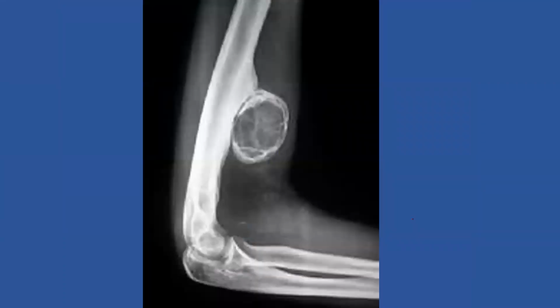So, with time, the previous X-ray was missed. With time, this patient had this lesion. Now, in this patient, you see that there is sclerosis at the outer end, and the activity of the lesion is in the center. Whenever you see such a lesion with sclerosis at the outer end, and it's healing from outside to inside, this is heterotopic ossification or myositis ossificans.